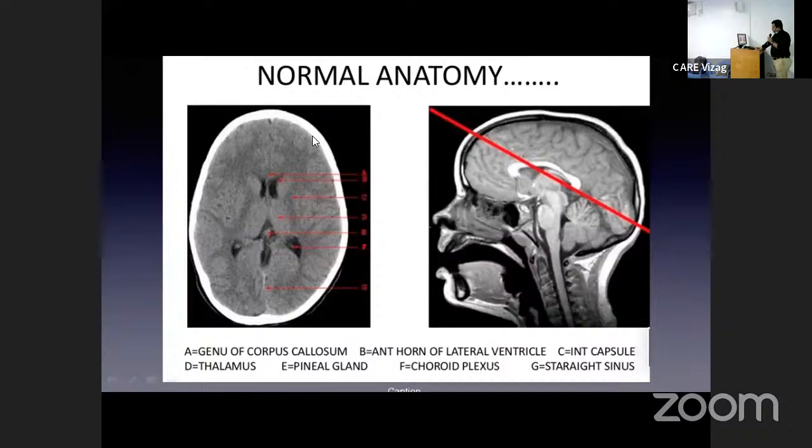There are cases when you see a large ICA infarct along with a PCA infarct also. In such a situation, it is understood that the ICA is only supplying the PCA via the PCOM. If you are seeing a large MCA and a PCA infarct, we must always check whether the ICA is infarcted and the PCOM is also gone, and there is no supply from the P1 PCA. In such situations, you'll see multiple territories being infarcted.